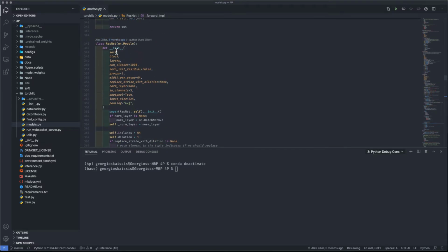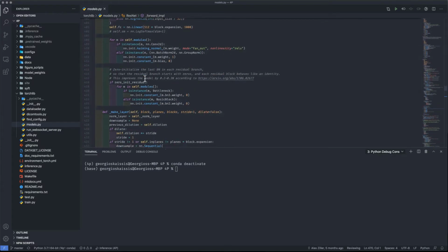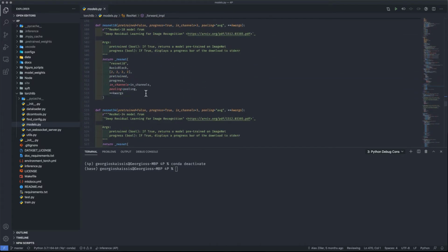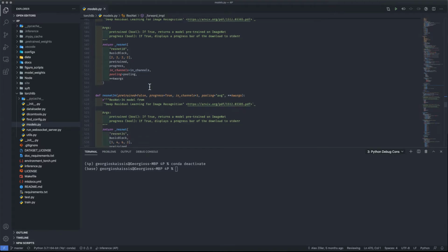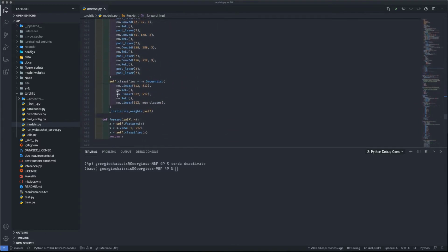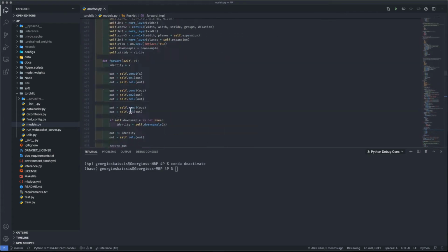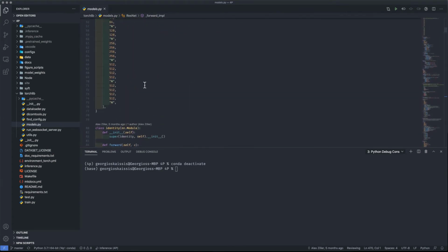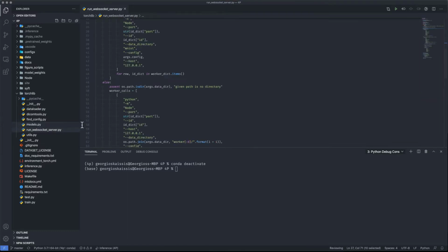And we've also got ResNet, and that's a ResNet 18, which is the one that we use for everything, because it's a very nice trade-off between number of parameters and performance. It's really good. So if you want to use other models and need to access the Torch Vision models, you can do so from here. Not all of them are supported in PriMIA, but they can be patched in with minimal effort, and you can add models here as well.